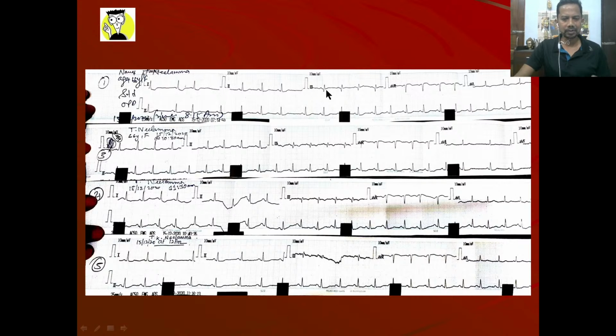There will be doctors who will say no, this is not MI, and the next day they will say, oh, the Q has formed. No, you should not do that. So this is the MI, and you have to be sharp enough to pick up this change. And then you look in AVF. Okay, AVF, sorry, the AVF got cut, maybe it will come in the next slide.